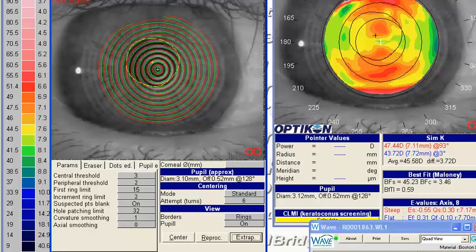And now by extrapolating, I'm going to take this data and run it up, in essence, under the lid. And I think that may give us a little bit better representation through there. And now when I hit Wave Design, give it a moment here for it to run the software. I'll pause the video while it's running that.